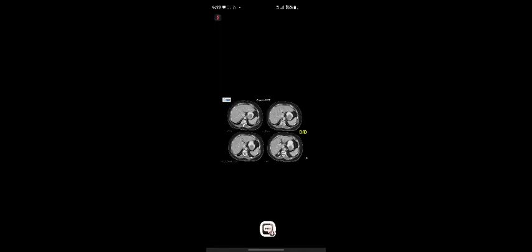Of course, if I report it, I'll say, please do an endoscopy, right? But now, just to develop your eyes, this is a very well-rounded type of a mass. Any differential? Leiomyoma is a good one. Anything else? GIST, excellent. GIST, gastrointestinal stromal tumor, stomach is the most common site, right? I'll show you. So this is the concept of an intramural mass, and this is GIST.